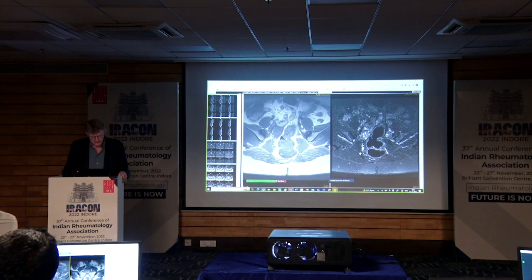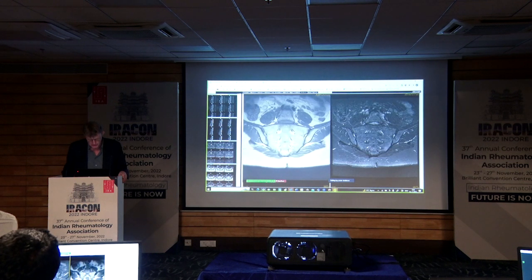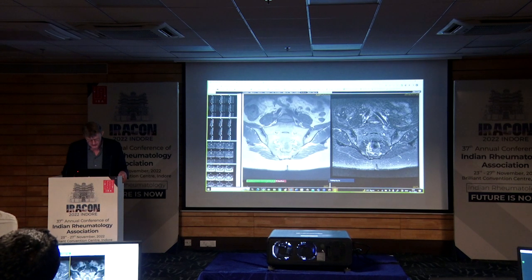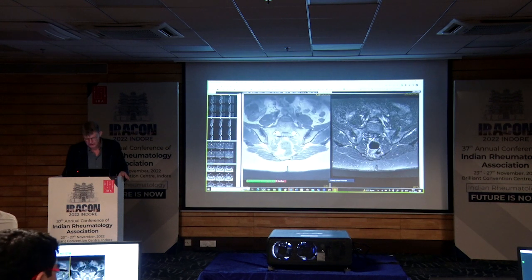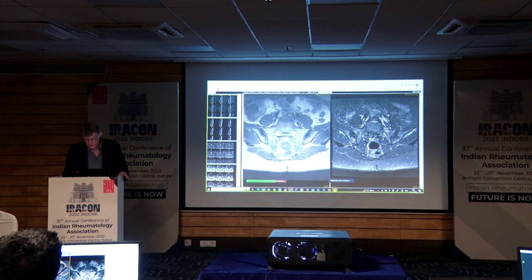As mentioned, it is a degenerative disease somehow, and thereby there is also a bit of degeneration, or a bit of irregularities here, where there may be small erosions. But the main part is definitely the sclerosis. Then there is a question of bone marrow edema, and if we look at some slices, like for instance this, you have an idea that this might be slightly bright, and if you go here, it may also be slightly bright in certain areas.